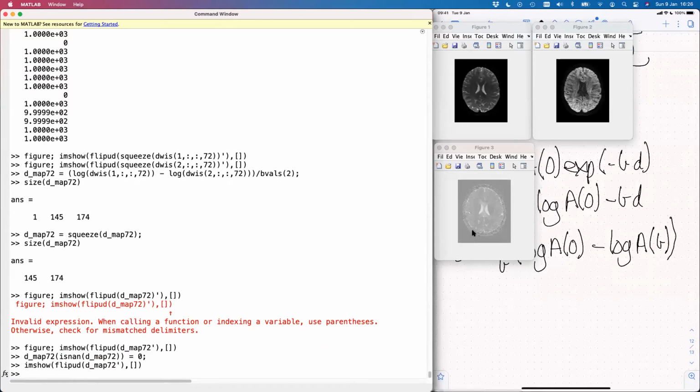So closer, but now we're seeing something else slightly strange, which is that the background, although these should all be zeros, has a sort of mid-grey intensity, and you can see a few black spots appearing.